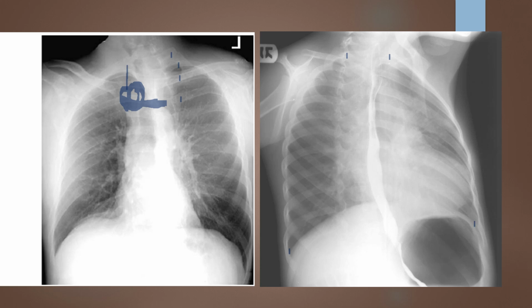I would say for this, I have a very long grayscale, almost excessive, and it looks like I have a little bit of a lacking penetration of the diaphragm. So I would increase my mAs and I would look at my exposure index. If I was low on the index, then I would increase my mAs and possibly my kVp. If I was adequate on my index, then I would probably decrease my kVp but increase my mAs to get that additional density that we're missing here.